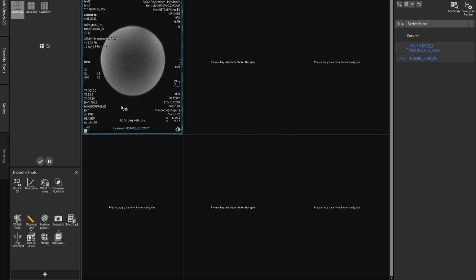And again, we'll be able to scroll through our data. We can click on multiple instances. So, do we want to see the entire subject? We can click on just the entire subject, click View and Go, and then we were able to take a look at the data in the View and Go tab.